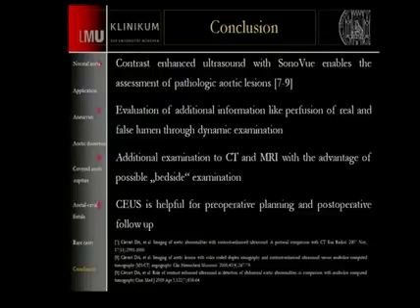And of course, this technique is also very helpful for preoperative planning. If we think about the covered rupture, where the question was, how far are the renal arteries away from the covered rupture? We could answer the question very clearly and say, this patient needs a special stent graft. A normal stent graft will not work here. And this was also confirmed by the CT examination. And therefore, for preoperative planning, this tool is also very helpful to find the correct or best treatment for your patient.